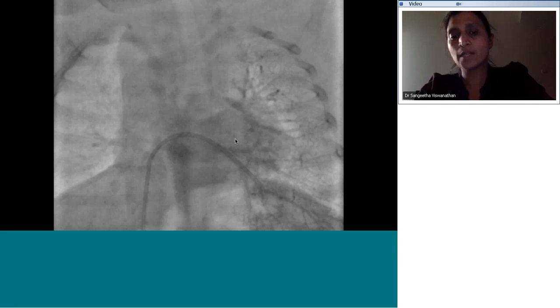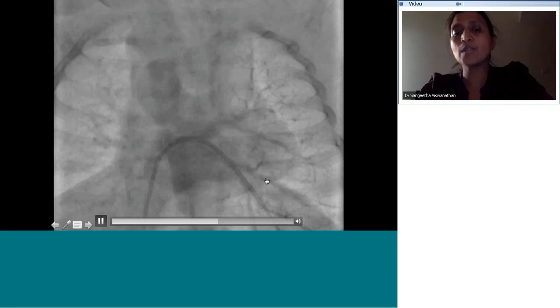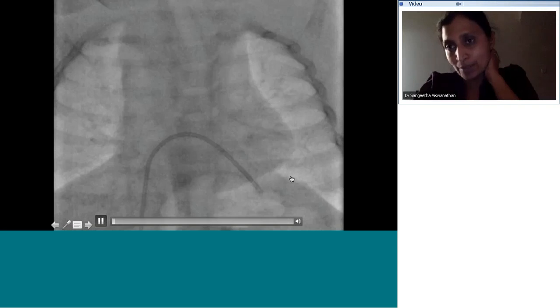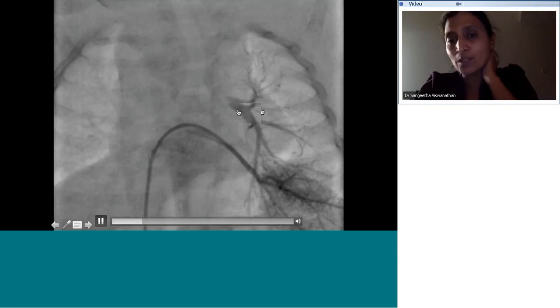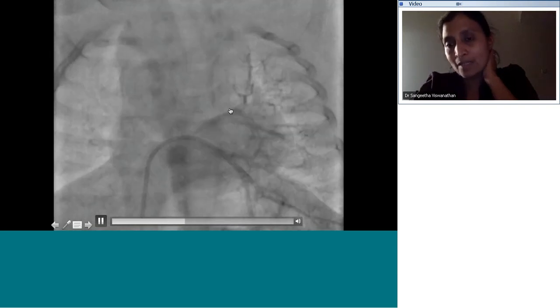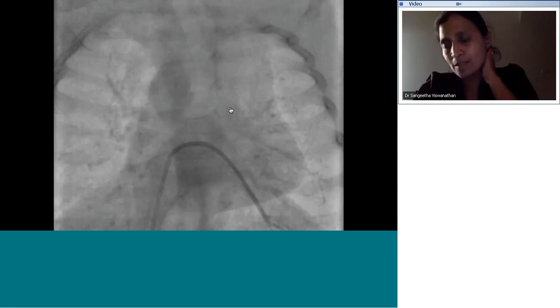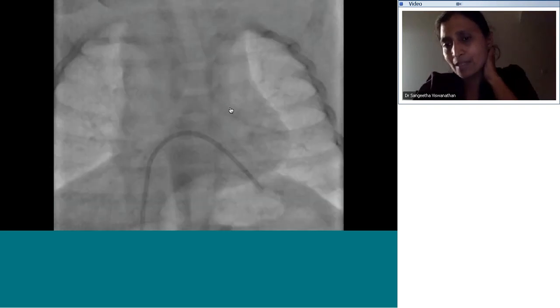Commonly associated with this is most likely the very fact that you're doing a reverse wedge means you're not able to get into the pulmonary artery. Okay, I'm looking at the fact that this small PA is disconnected. What is the likely underlying diagnosis? Disconnected LPA, what is the likely underlying diagnosis?